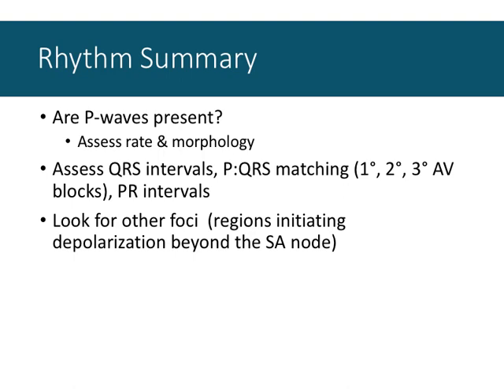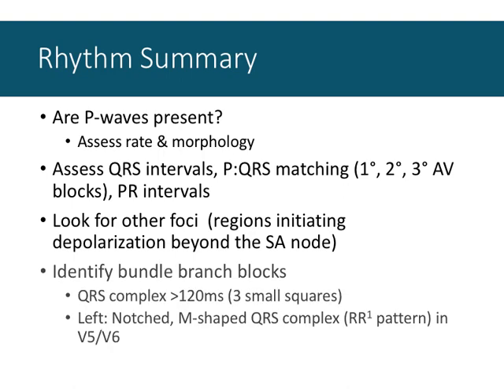that's abnormal? If they're not all abnormal, is it that there's possibly multiple foci, different regions that are trying to spontaneously depolarize? Maybe there's multiple ventricular foci, maybe there's multiple atrial foci. It's certainly easier to diagnose differences in the P wave and identify multifocal atrial rhythm. But you want to compare the characteristics that you've just looked at. In doing that, some of the concrete examples that we just talked about will become more obvious.